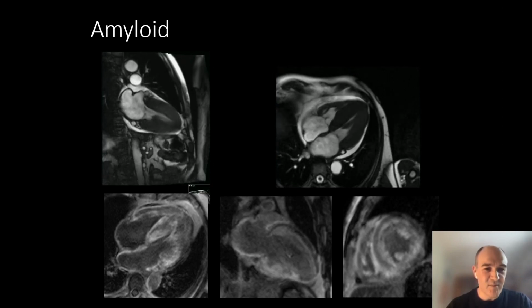We've talked about the patterns associated with a DCM and an ischemic cardiomyopathy, but here you can see diffuse abnormality of the late gadolinium enhancement throughout the myocardium. Sometimes described as almost a circumferential subendocardial late gadolinium enhancement with a relatively preserved strip in the mid-myocardium and then a subepicardial ring of late gadolinium enhancement, described sometimes as zebra striping. When our radiographers are acquiring late gadolinium enhanced images and they're looking to try and work out what's normal myocardium versus abnormal myocardium, these are the cases when they're training they have most difficulty with, because there's really very little normal myocardium to compare with.